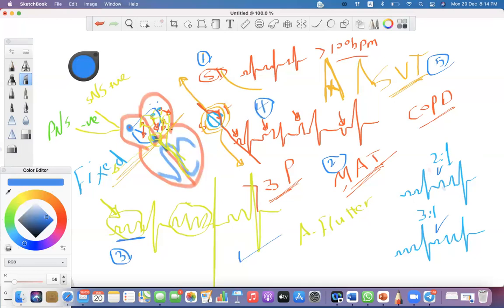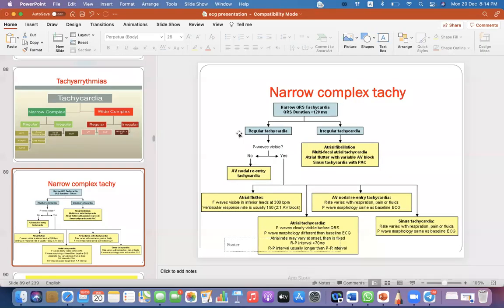If you see, all atrial tachycardias have a narrow QRS, as a general rule we mentioned before. Any tachycardia or any electricity arising from the atrial level, from the AV node and above, is narrow QRS. Ventricular tachycardia will be a wide QRS complex, as we will discuss in the next slide. So let's apply and see the ECG of these patterns. Let's go to our presentation.